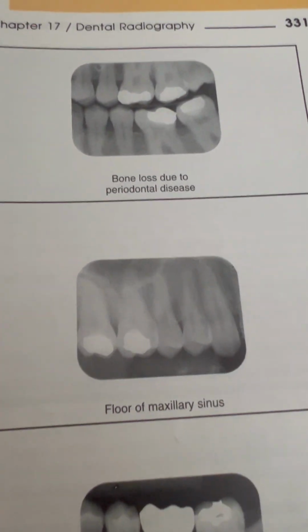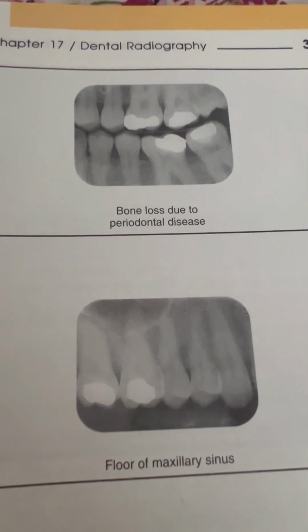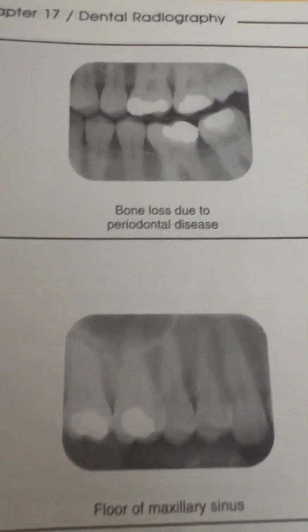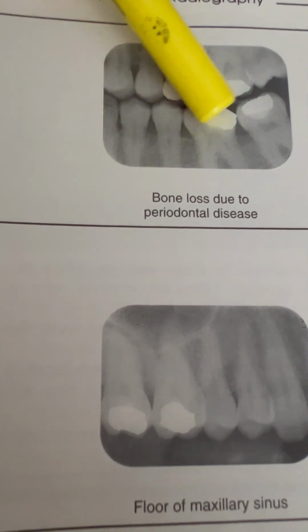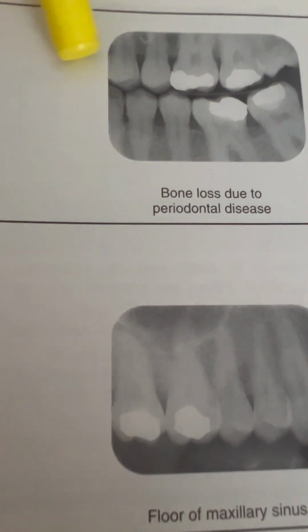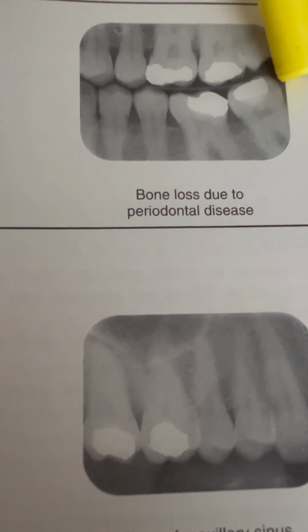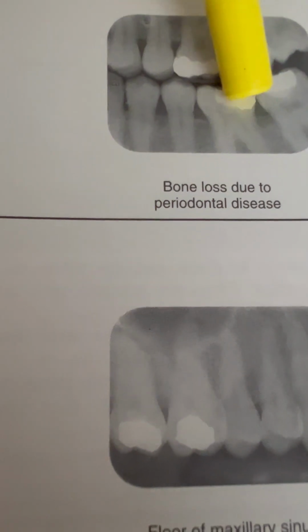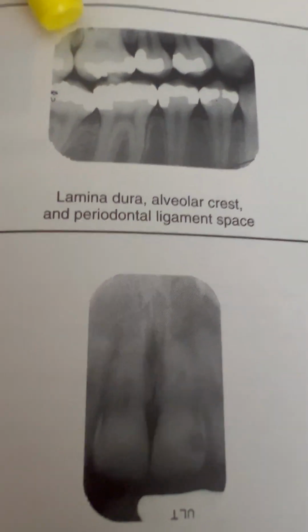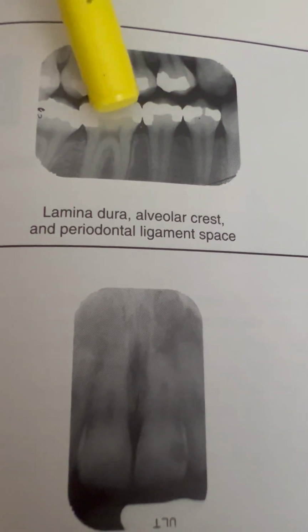But when you go in as a new patient, then of course they will take several of these individual films. If you notice this one where the teeth are biting together, that's exactly what it is. It's bitewings. And of course you can tell the ones in the back because of the smile line again. It goes up like that. And the premolars and the molars. And these are fillings in the teeth. Again, we'll talk about that some other time, once I have the treatment plans and we're reviewing them or answering questions about them.